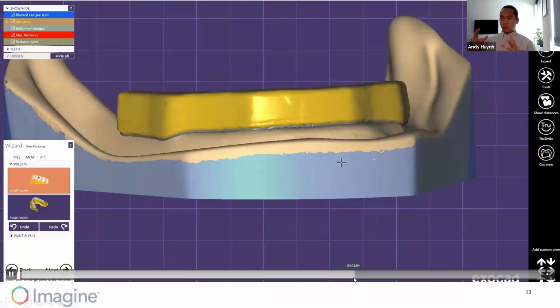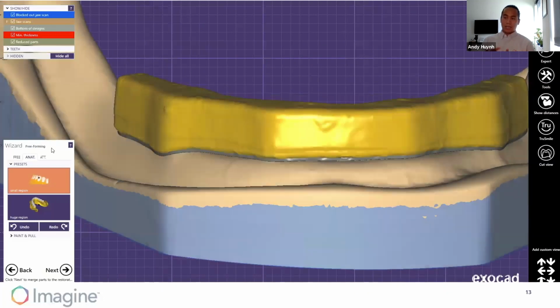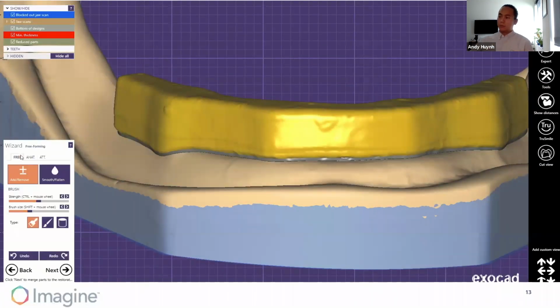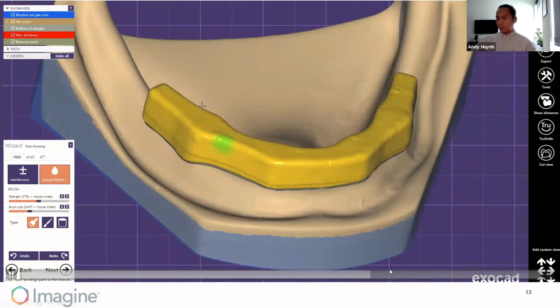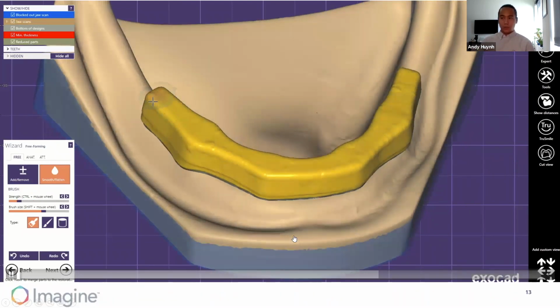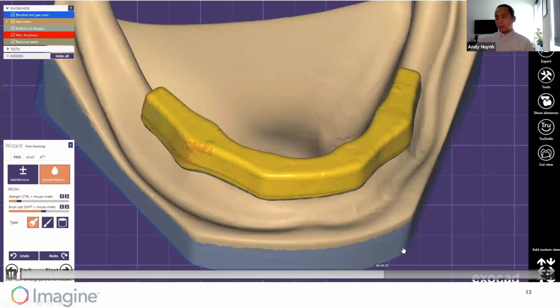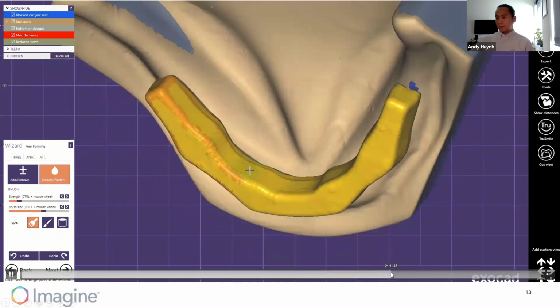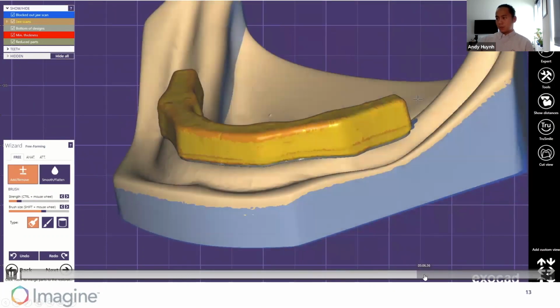And here is your offset bar. Now you can always adjust that, and you also have the option to adjust how thick you would want that to be. Again, this is just free-form smoothing. And then here in the attachments tab is where you can attach your ring donuts or whatever else. It's an extensive library. So we're just going to skip ahead.